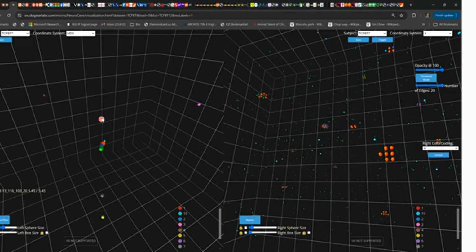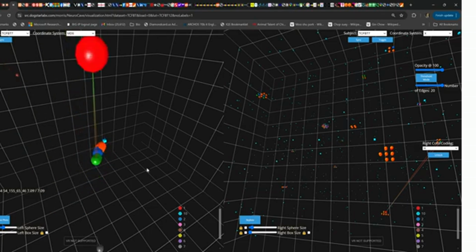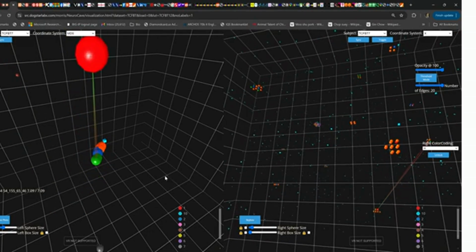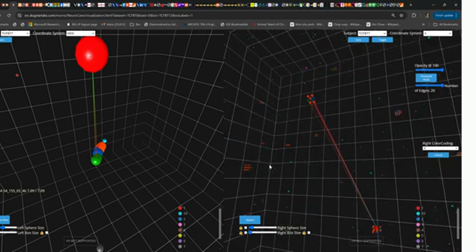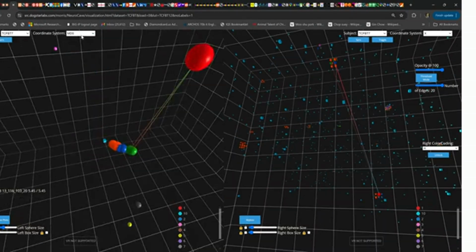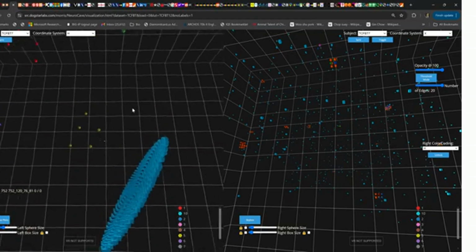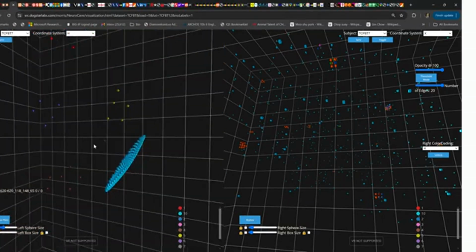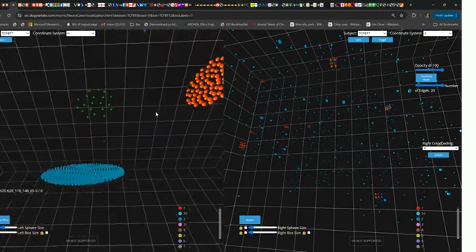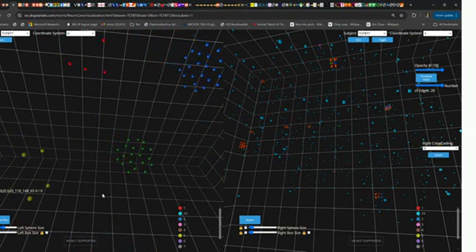Let's take a look at this red one here. So it looks like it connects those green ones. You can see it clearly on the MDS view and also in the anatomical view. We can also rearrange the nodes to really separate out the clusters into their own artificial regions that are just clustered together on the faces of a platonic solid.